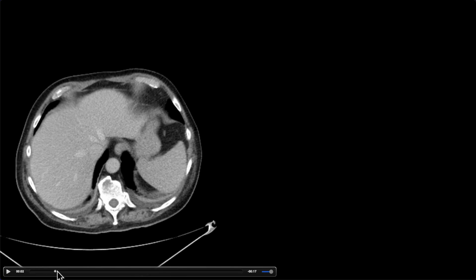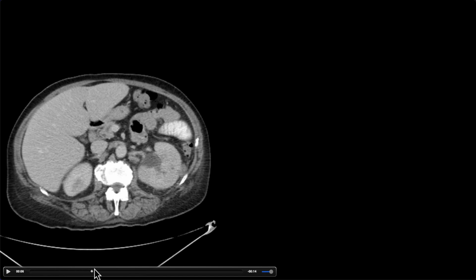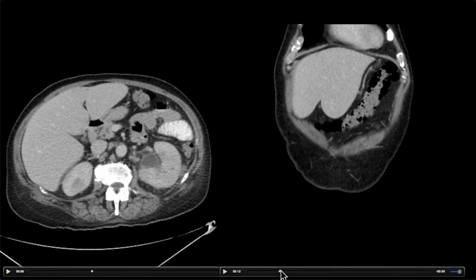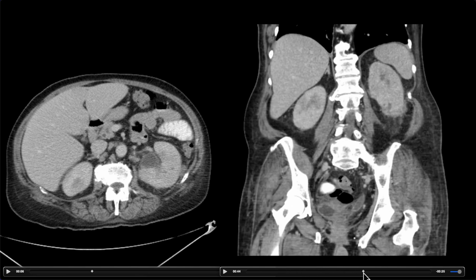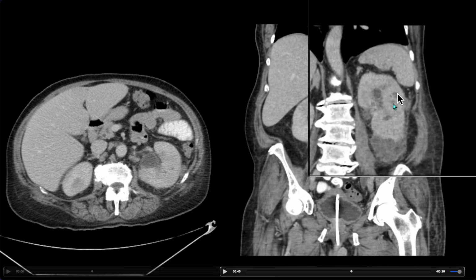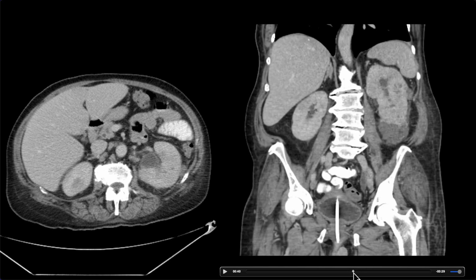All right, and for this case, we're seeing again left renal relative enlargement of the kidney, relative hypoenhancement of the kidney, and we're also seeing multiple abscesses within the left kidney, with an important variation in this case where we have a combination of these microabscesses which have formed within the upper and interpolar cortex, and then this larger collection in the lower pole.